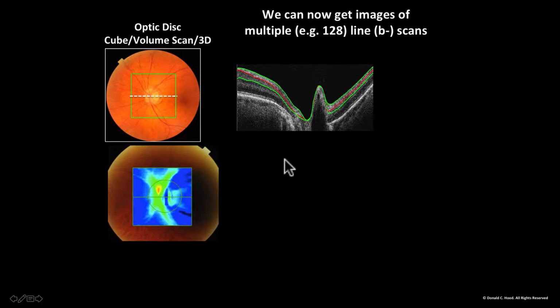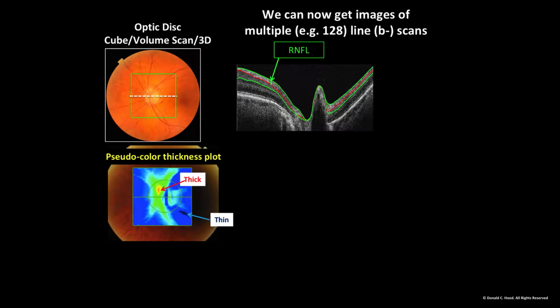So, in this particular case here, there are 128 scans obtained within a few seconds. Each one looks something like this on the right here. That's the retinal nerve fiber layer. This is a pseudo-color thickness plot now of this entire region. And again, red is thick and dark blue is thin.